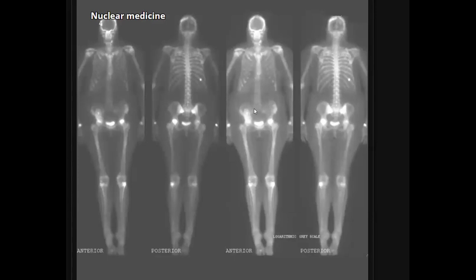In such a case, you need to have other views. You want to check the uptake in the hip and in the femur to check the areas which have the transplanted kidney. So does anyone think about what the abnormality could be? Why is there patchy uptake in the head of the femur on both sides? In the transplanted kidney, this patient usually takes steroids and finally ends with which type?